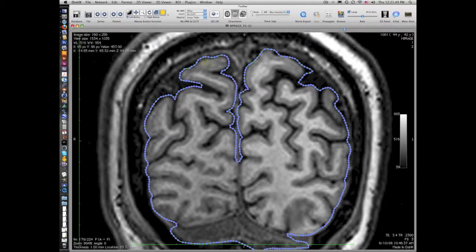Notice it gets smaller the closer I get to the spline. If I click very, very far away, I get this big radius, but it's not a great tool, and it's very time consuming and very slow. But it's good for doing stuff like this, moving this back in.